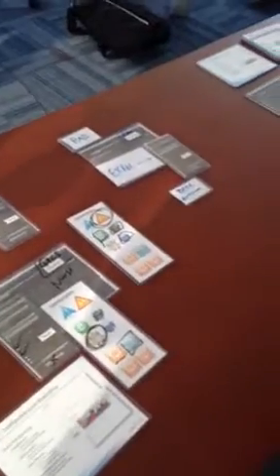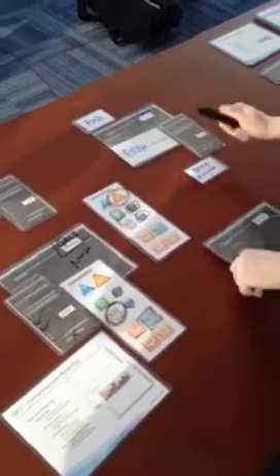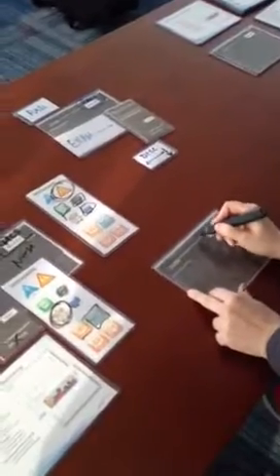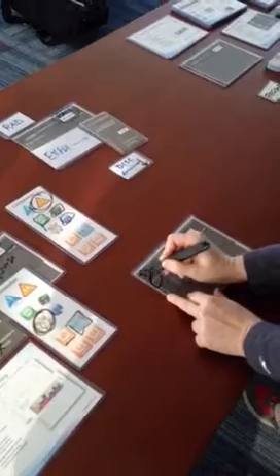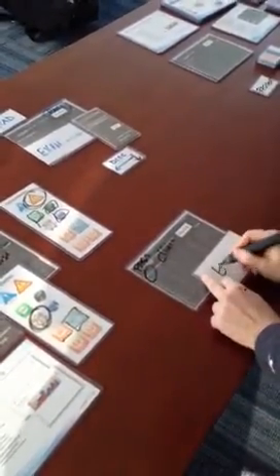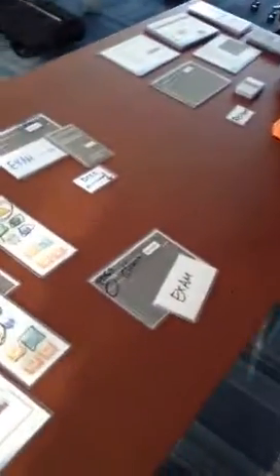You can even do additional things. Let's say you identify a discrepancy and you want the radiologist to have a clinical review once a month with the ED staff. We could actually, when the discrepancy is created, create a clinical review work list. And from this panel, we can launch the PACS and bring the images right up. So you can look at the exam together in a clinical review, the ED doc and the radiologist. So that's kind of a simple workflow.